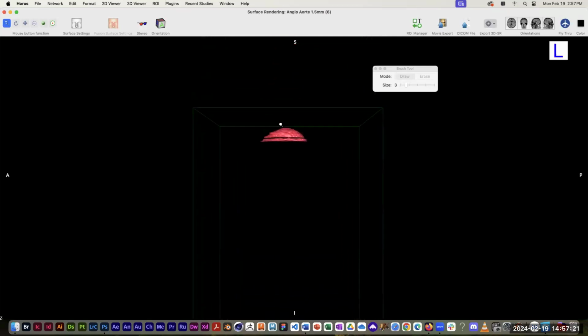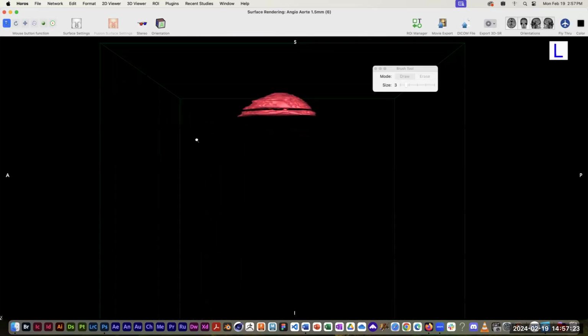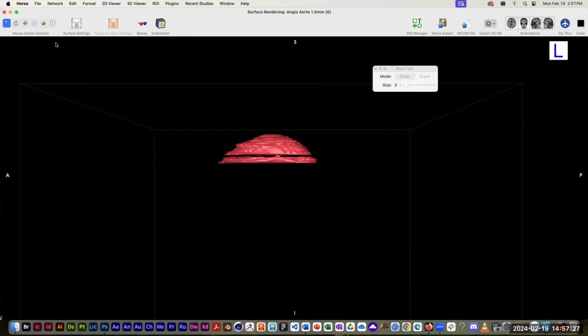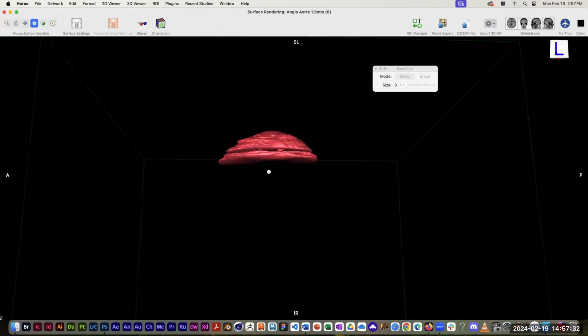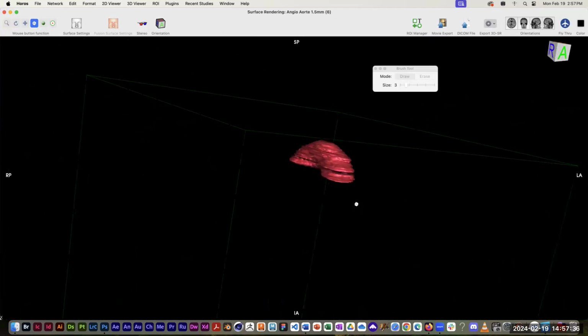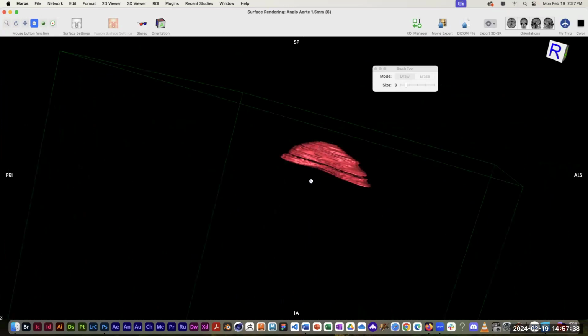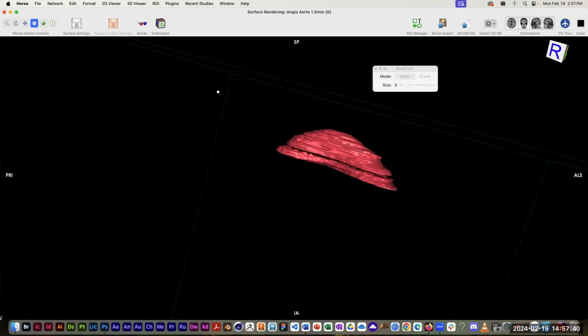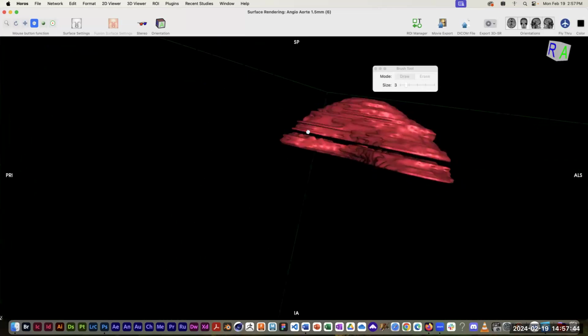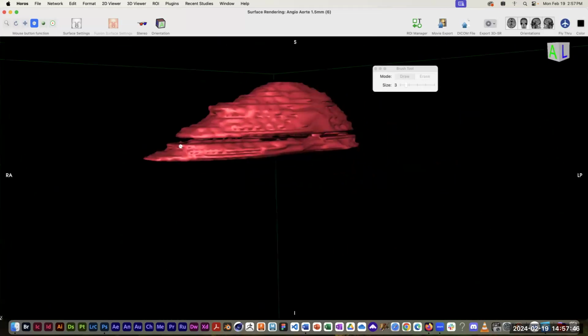all that for that. That's why I said it. And I have a feeling it did not select some of my ROIs, maybe the ones that I screwed up and put multiple ROIs on there, because notice there's a little slice missing. That's user error, apparently.